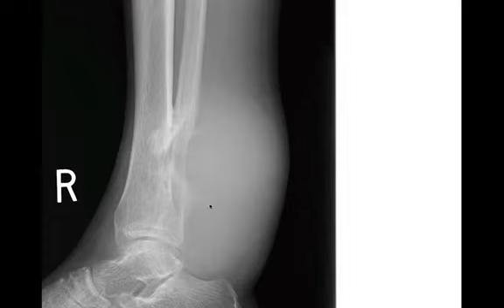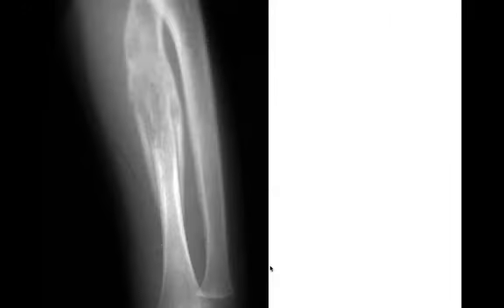This one doesn't really have a lot of periosteal reaction. You see there's some bone which is lifted up from the cortex right here and extending out. You get the sense there's this giant soft tissue mass associated with it. So this one doesn't really fit nicely into our descriptors, but perhaps it looks a little scary just because of this giant soft tissue mass right here. In this case, this was a recurrent osteosarcoma that wasn't treated fully and then had returned, and so this periosteal reaction, almost Codman triangle-like, with associated soft tissue mass in this region. So this was a recurrent osteosarcoma. It doesn't look like a typical osteosarcoma in this case, probably because it was incompletely treated.